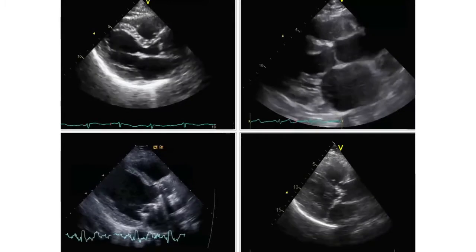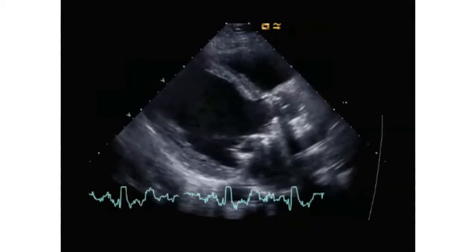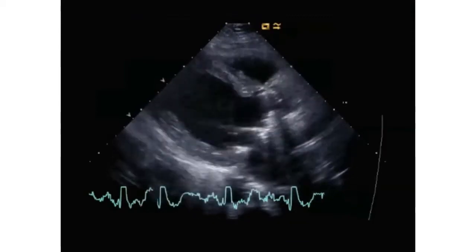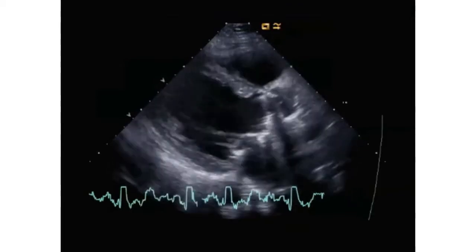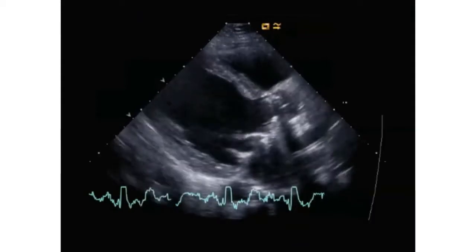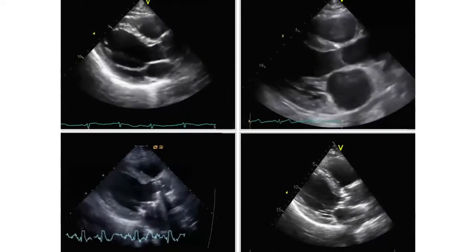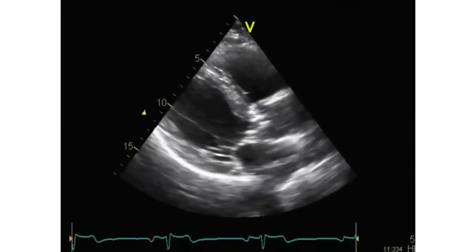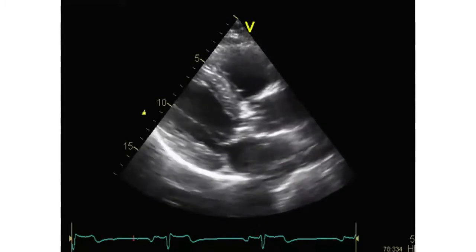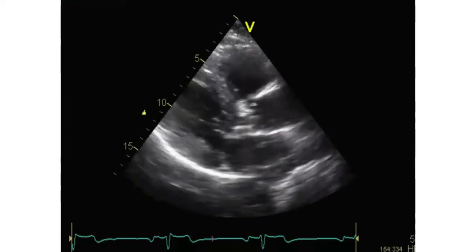This is quite awkward, but do you think this is the case with aortic stenosis? Look carefully, and at the end, I'll show you the last example, with again another aortic valve. So, if you made your choice, we are ready to give you the answers.